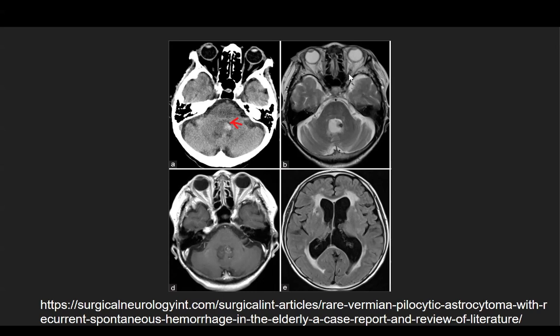It's a cerebellar lesion. Okay, it's a cerebellar lesion. Where is it in the cerebellum? Vermis. Exactly, it's in the vermis, and I was surprised that nobody read what was written in the smaller text below.